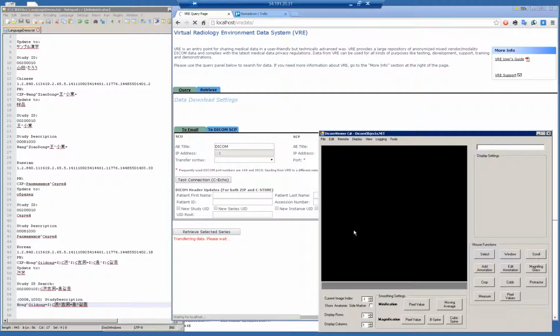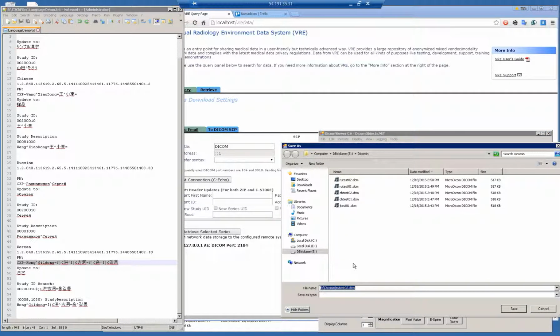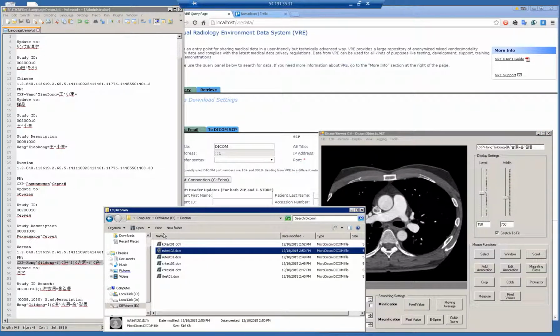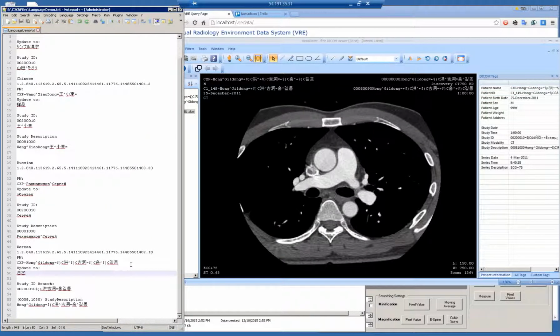When it's received, we can see what the patient name should look like here in Notepad++. There it is. We can save the file. Open it in a clinical viewer. And verify it matches there. And it does. I mean, to the extent that you can sort of identify the character sets which may be unfamiliar.